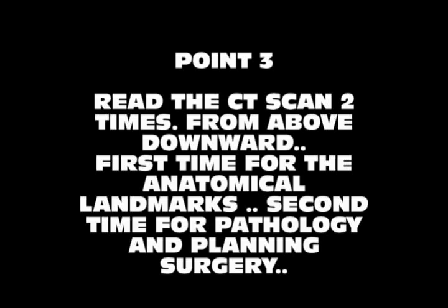Point 1 is always read the CT scan from the first cut. Point 2, read the CT scan cut by cut. Do not jump from one cut to cut 5 like that. I have seen several residents going to first, then 6th, then 7th. Never do that. Point number 3, read the CT scan 2 times from above downwards. First time is for anatomy, second is for pathology and planning surgery.